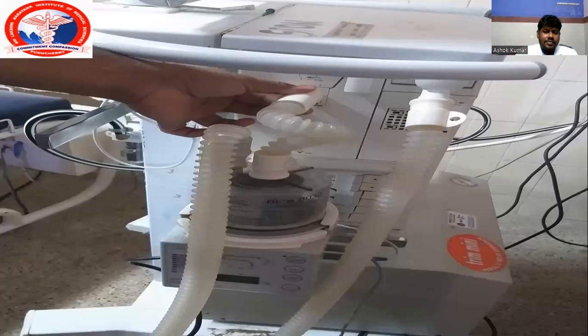And from the inspiratory end of the ventilator, it is connected to the humidifier. From this picture, the inspiratory end of the ventilator is connected to the humidifier. From the humidifier, there will be an inspiration tube. From the inspiration tube, there will be a Y piece, and at the other end of the Y piece, there will be the expiration tube. The expiration tube is connected to the expiratory cassette, which is attached to the ventilator. These are the basic circuit for the mechanical ventilation or ventilator.